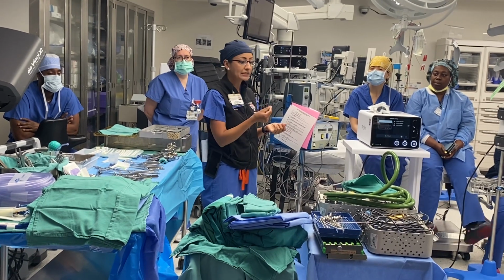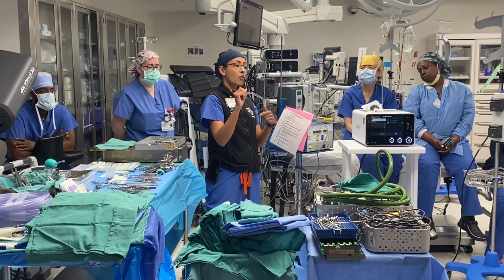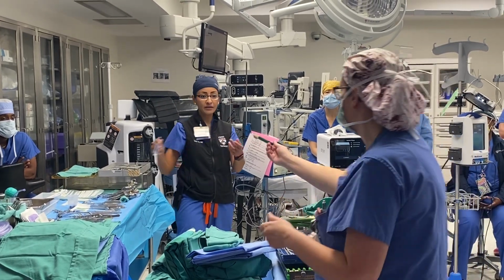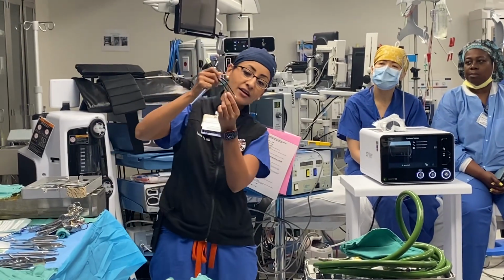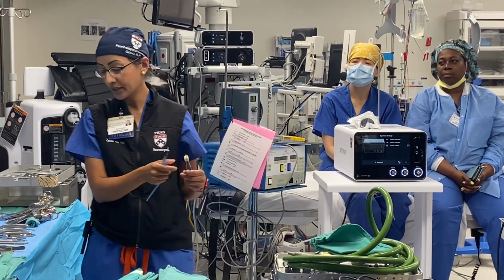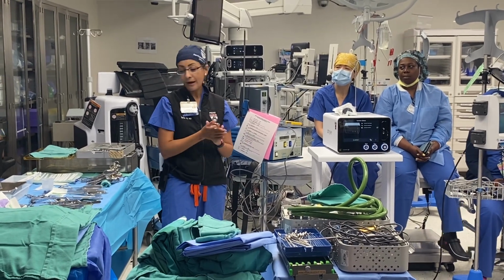Sometimes we will utilize the irrigating bipolar. The nice part of the irrigating bipolar, unlike these, is that, remember, all that char builds up on these, whereas the irrigating bipolar, because it's irrigating, gives you less of that. This gets connected to saline through that bulb, and it comes out through this little hole here. When we use it, it irrigates automatically, so you get a little less char. There's no perfect one, but we'll use one or the other. The idea is still the same: we're coagulating, then usually using micros, and then we're resecting.